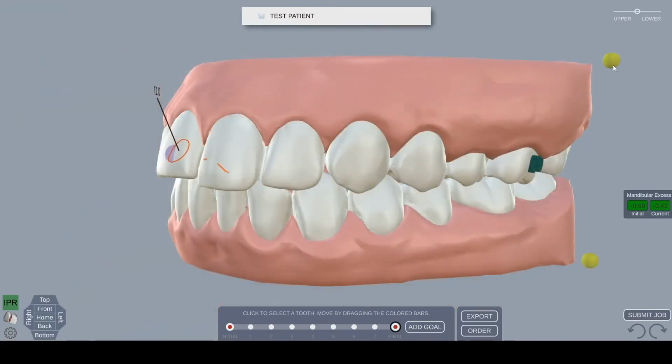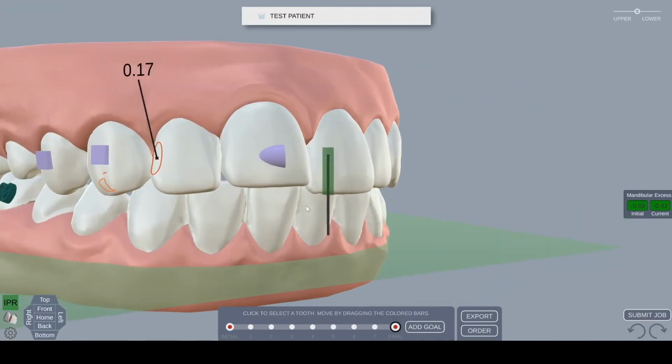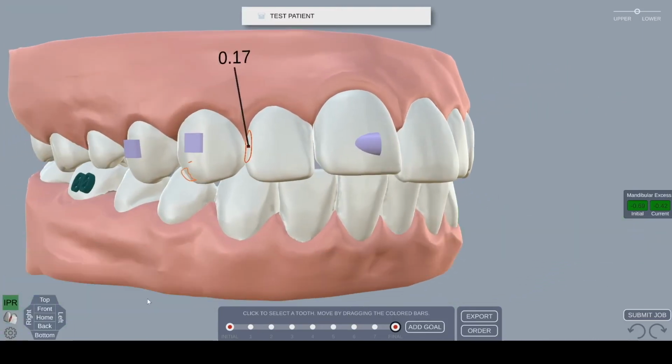You will notice yellow dots floating behind the model. Clicking on them reveals green sliding bars. Dragging those down brings down the cutting plane. Position the plane where you want the model to be cut during export.